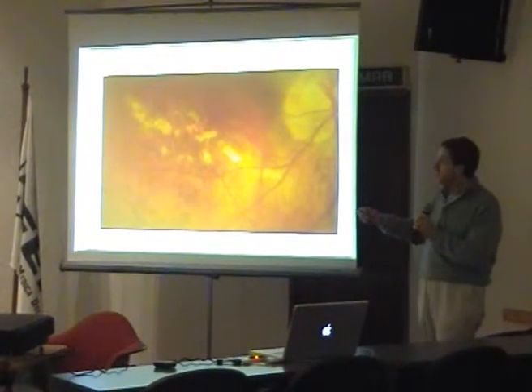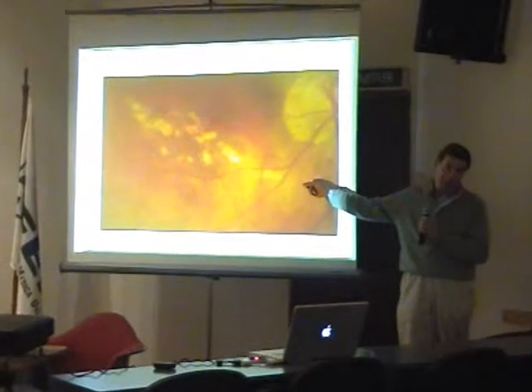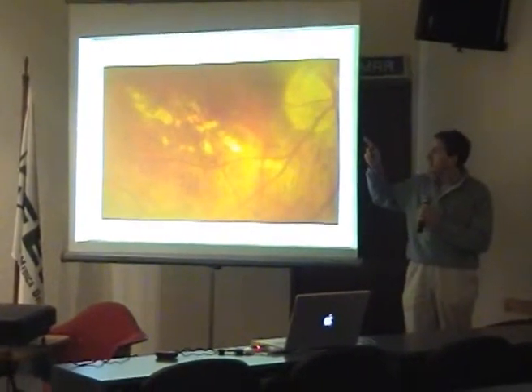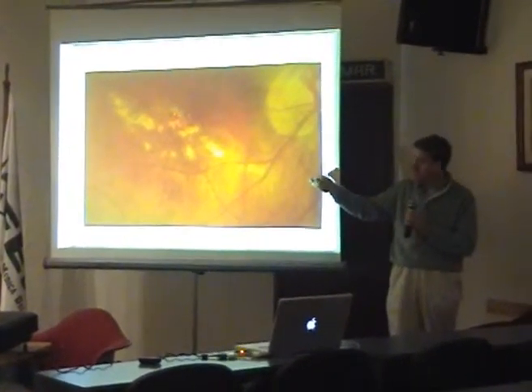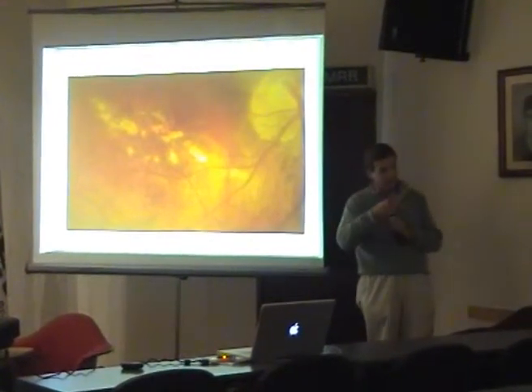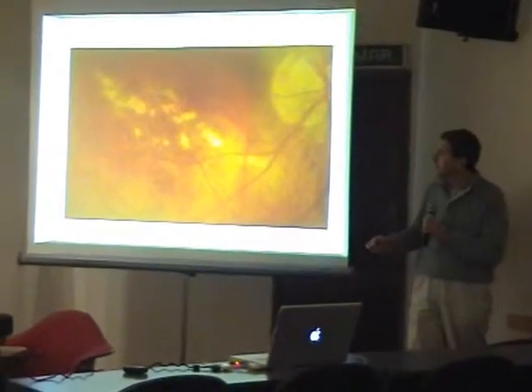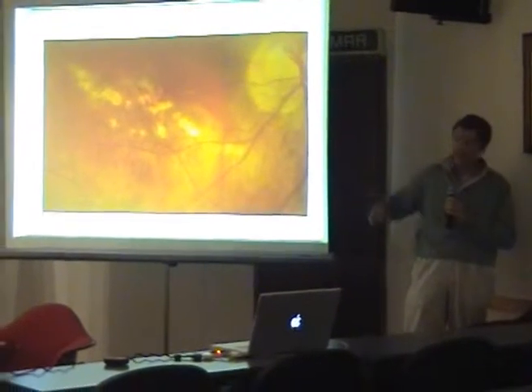This patient wanted to have, 1 month and a half before this image, Avastin directly for this CNV instead of PDT, because the other eye 5 years before had some not good results. So she refused PDT and she wanted Avastin immediately.